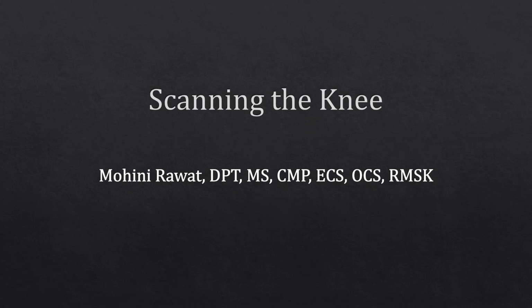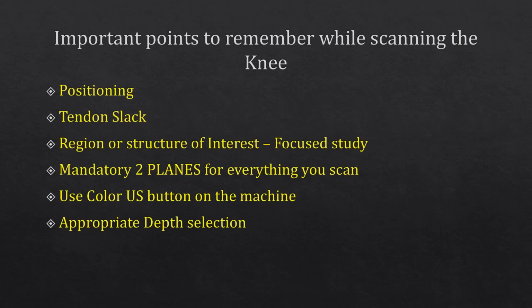This is the basic level, so people who have just started doing it, or maybe you have done a couple of them, you may find these important points useful when you're scanning your patients with knee problems. Okay, so these are the 6 important points that you have to keep in mind when you are scanning the knee joint or knee area.